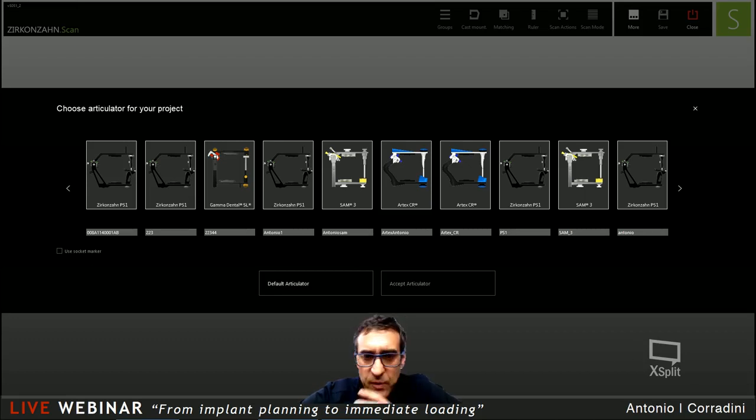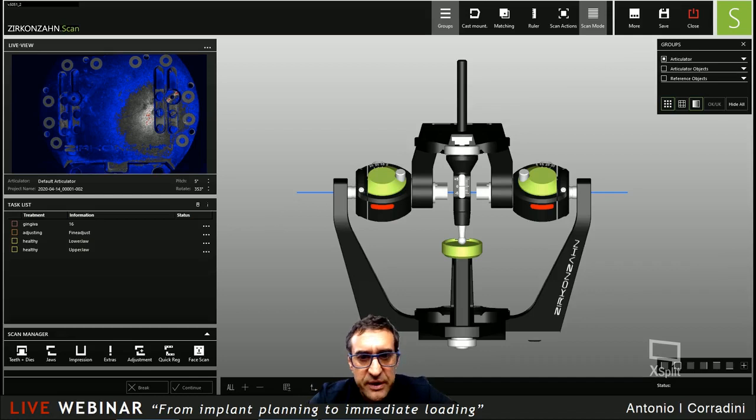So using a Facebow, a regular Facebow, or using our system, the plane finder, which is follow the natural head position, for example. And in this case, we would see also the process, the workflow to mount the patient into the articulator. So forward to the software, and here we are in, let's say, into the plaster room. Let's say that we can load and match data together, etc. So as we say into the presentation of the webinar, here finally we have digital data.